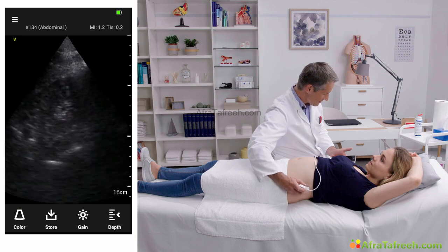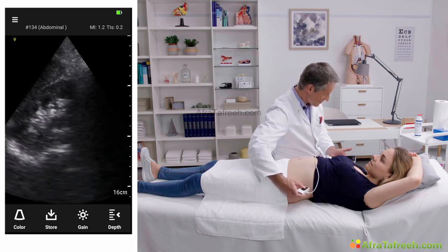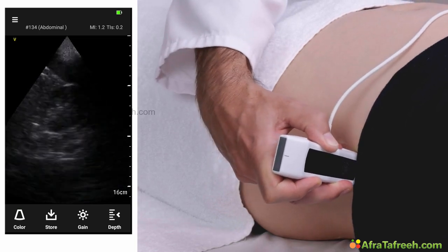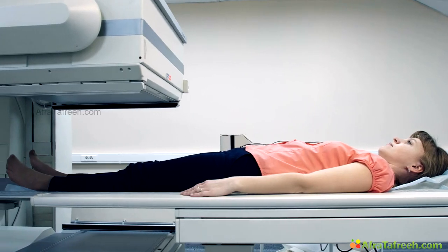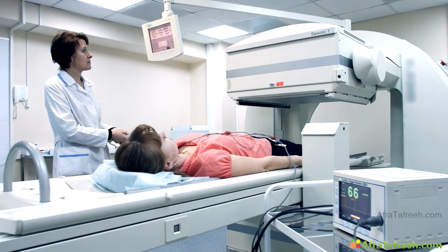Ultrasound is by far the most commonly applied imaging technique for the detection of renal diseases. It is quick, cost-effective, and allows visualization of the kidneys and the urinary bladder. Combining the findings obtained with ultrasound with the patient's history and laboratory results is usually enough to establish the diagnosis. All this is possible without exposing the patient to radiation. Clearly, ultrasound has dramatically changed the way we approach patients with urinary tract diseases.